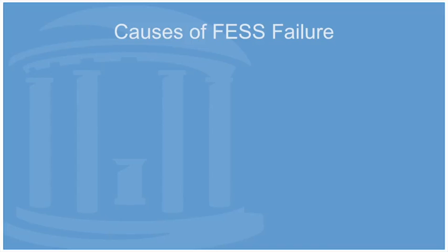So now that we're all familiar with the typical post-FESS appearance of the sinuses on CT, let's turn our attention to some of the potential causes of FESS failure. Fortunately, when coupled with adequate medical management, primary FESS procedures produce durable treatment responses in the vast majority of cases. However, about 10 to 15% of patients undergoing primary FESS will fail their initial surgery, requiring them to undergo one or more revision surgeries down the road.